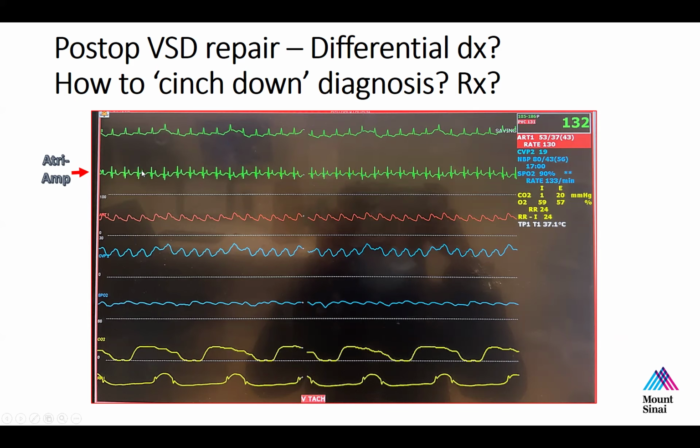And so in this particular case, if this is the QRS, which I agree with you, it is simultaneous with it, what is this signal? So this is pointing to the P wave. Again, I would prefer you use the term atrial electrogram because you're correct, that is where the P wave would normally follow. But you should think of it as augmenting the P wave by recording directly from the atrium itself. So that's the atrial electrogram. Now you know the relationship between the QRS and the atrial electrogram. So the question is, what do you think this is then?